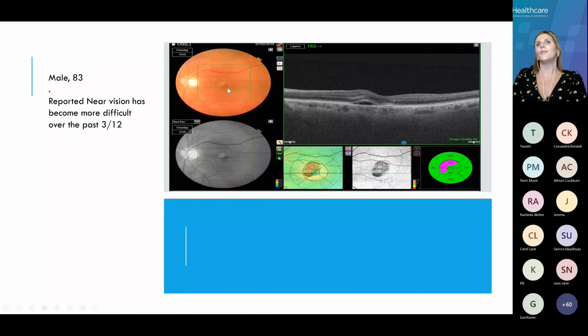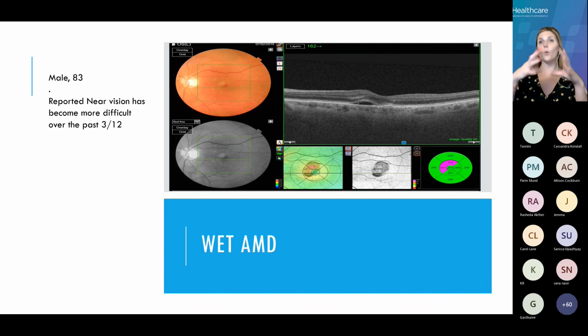Now, again, not just using our B scan, because we can see the areas here of change, and we've got this kind of little suspicious area of high reflectivity in our bottom layers here when we're looking at our sub-RPE sections and fluid in this section as well. But looking at our fundus, looking at our thickness maps and our shadowgram, we're actually able to see that this is a case of wet AMD. Now, with some patients, you expect, and I get asked this a lot, that a wet AMD patient would typically be all over the place.